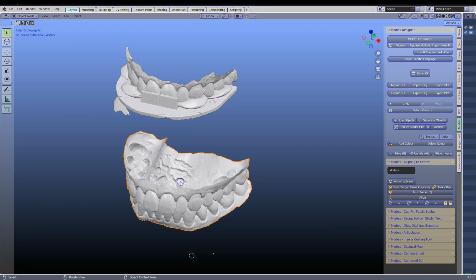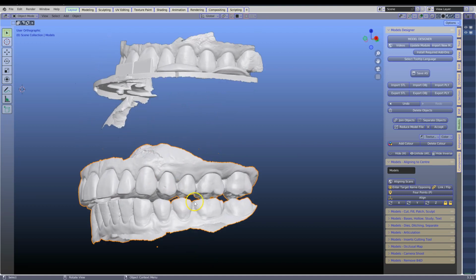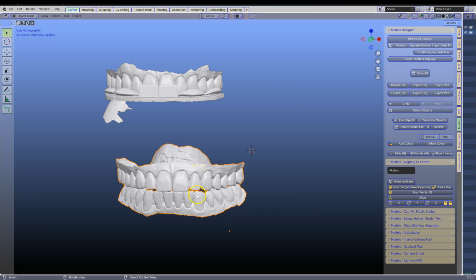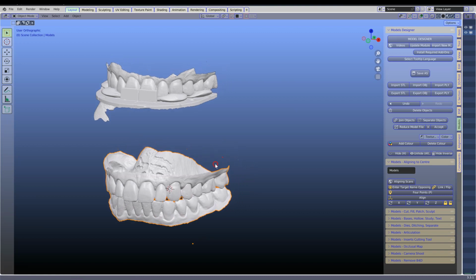We also need an intraoral scan of the upper and lower in the occlusion that you have set in the patient's mouth. From here on, make sure that these two are joined up into one STL model.